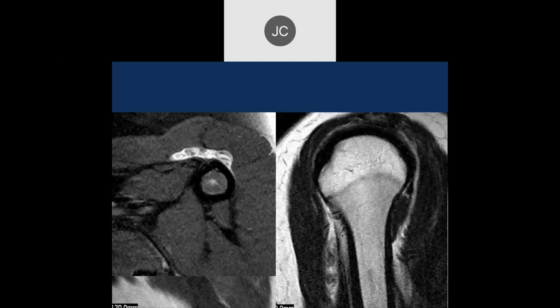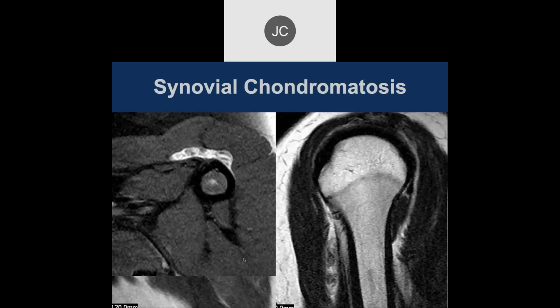Where are we? Biceps here, so this stuff. Not sure. That's synovial, it's extending down along the synovial sheath going along the biceps. It's really technically intra-articular, but it's extending out past the joint.